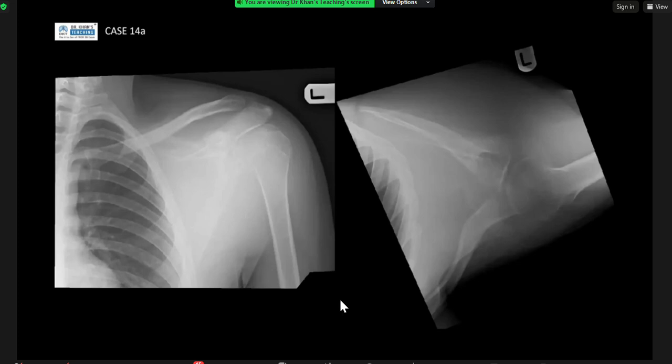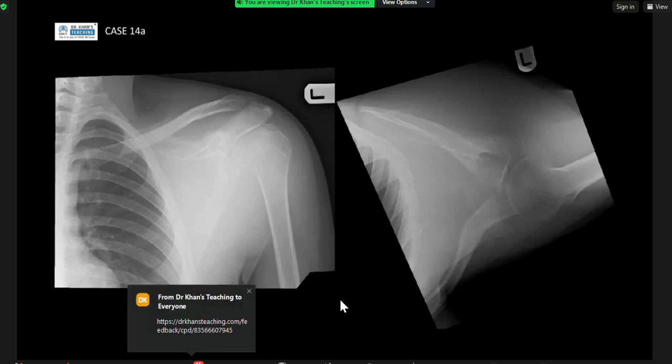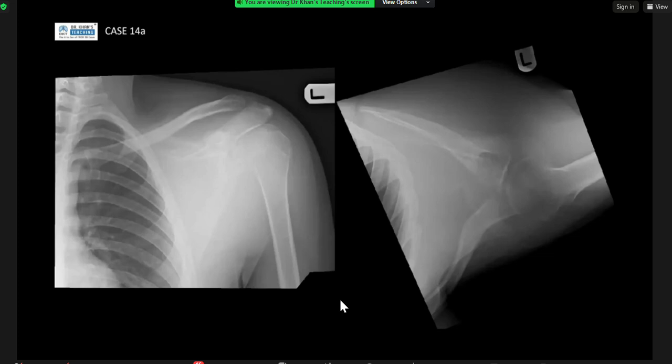More of a soft tissue etiology I'm suspecting, and for further comment I would go for cross-sectional imaging. Looks like an aggressive lesion, probably involving both soft tissue and bone. Would you do a CT or an MRI? You said cross-sectional. MR.